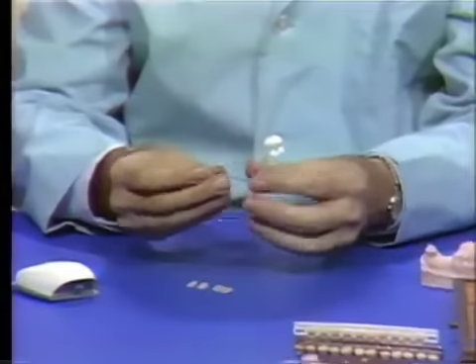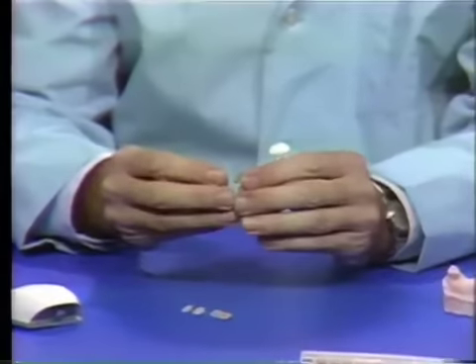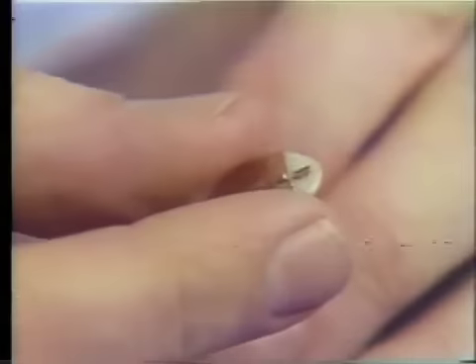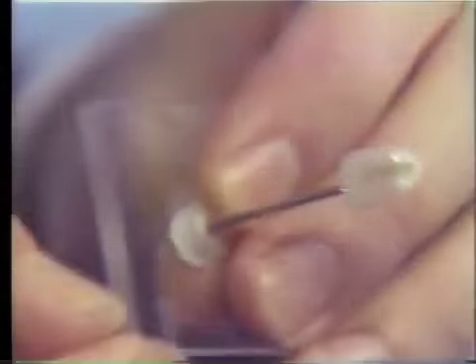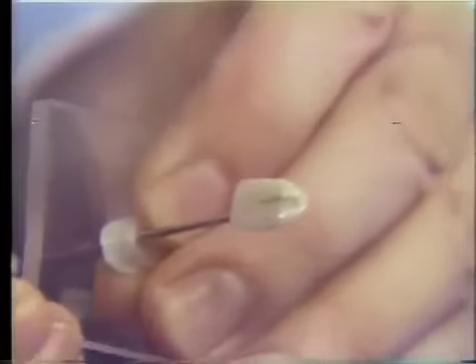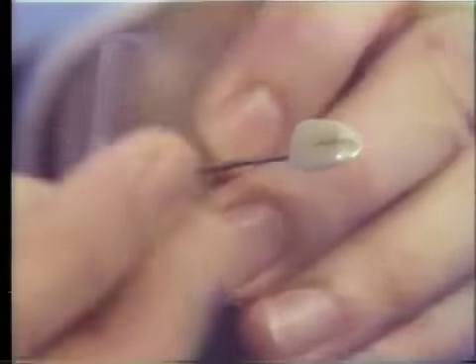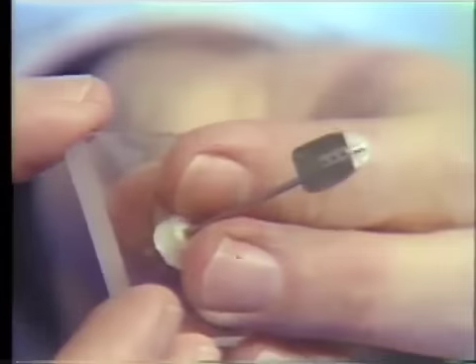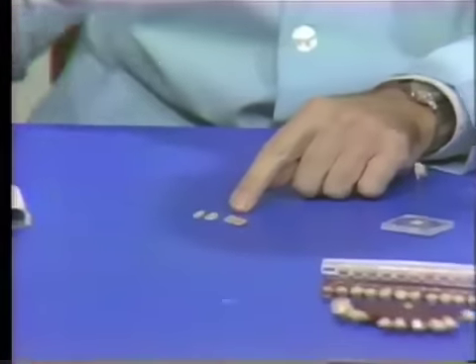That was an enlarged model, and this shows you the actual Steele's backing and facing, which is mounted on a little display model here. This is the precious metal backing, and there I think you can see the facing quite well. This is in a high fusing gold to which a casting can be made against that. This has, of course, to be trimmed after the facing has been cut and modified to suit the particular clinical case. And just down here we've got 4 facings here.